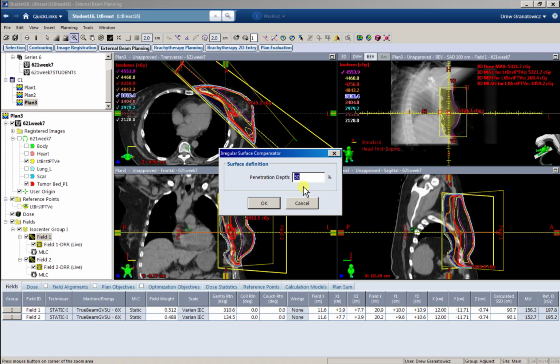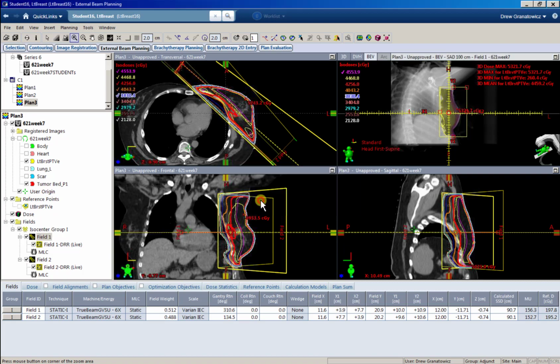If we're at 24 cm separation, I'll set it at 45%. If we're way less than 24 cm, I'll go all the way up to 50%. If we're way over 24 cm, I'll go as low as 40%. So I kind of go 40 to 50%. We're right at that 24 cm separation, so I'm going to just put 45% in here.